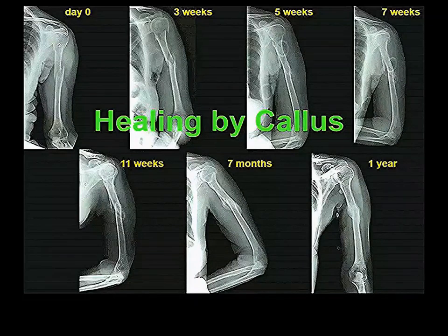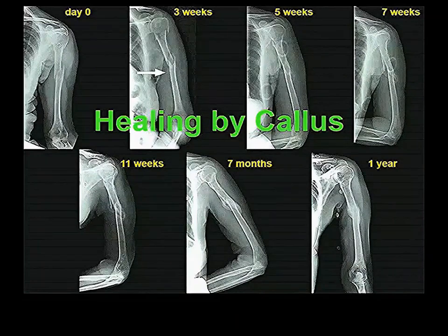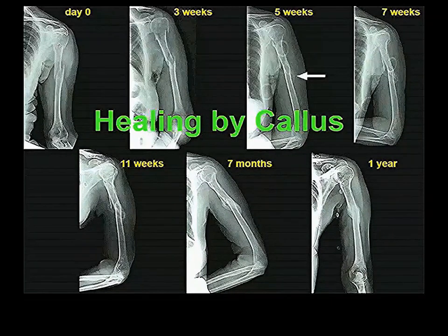That fibrous tissue will then start to turn into cartilage. That cartilage will calcify, and the calcified cartilage will be replaced by bone. Generally, the bone starts to form a little after the first month. There's a little whiteness there that's probably some calcification of the cartilage. It's more obvious here. You can see the little white area there and a little white area there. That's probably the beginning of bone formation.